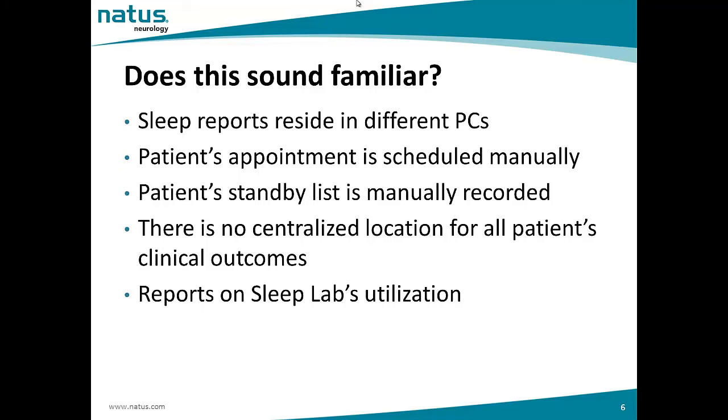And in my experience, there are some sleep labs that actually record all the individual patients' clinical outcomes like AHI, total sleep time in an Excel file so that the doctor can use it for their presentations or lectures. And of course, there's a lot of times that the hospital's management will ask for a report on the sleep lab's utilization. What is being done now is that it is manually counted, like how many studies have you done last month or 6 months ago or for the last 5 years.